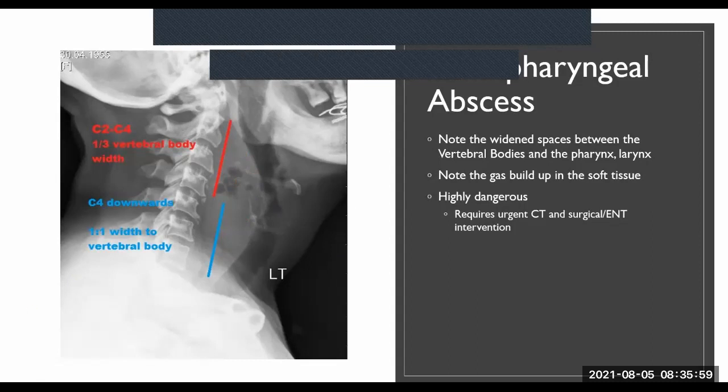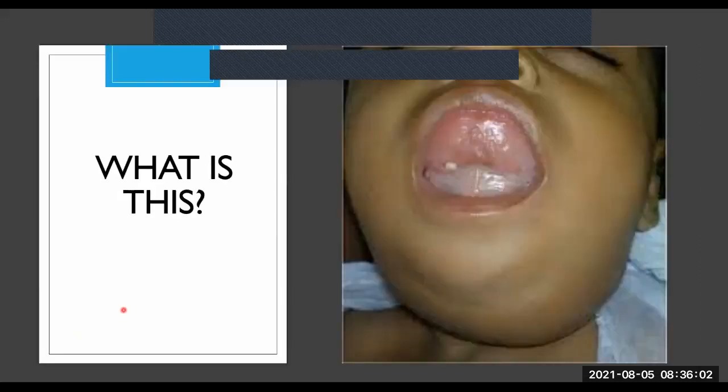Okay, right. So what is this? I know it's not an X-ray of the neck, sorry, but I just want you guys to have a look and see what's going on. Very good. It could be epiglottitis. Could be mumps. All right.